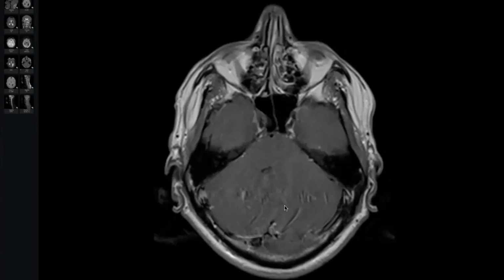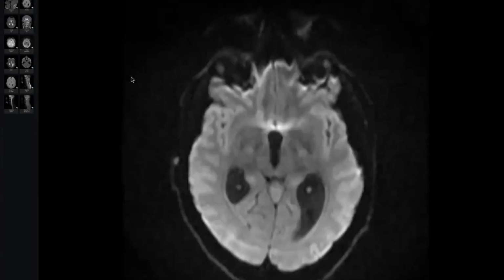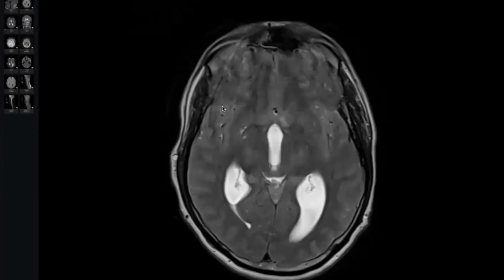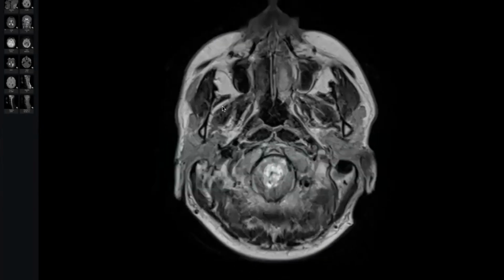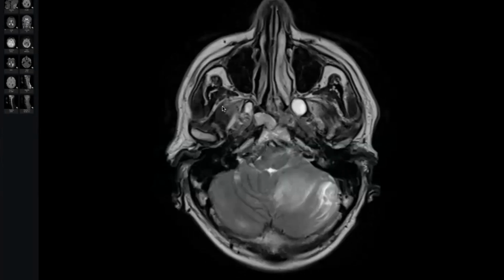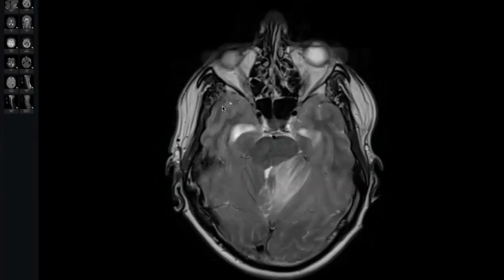First, we should talk about the brain because there is mass effect. See here, there is marked compression of the cerebellum. So we must talk about this at least. And then our routine usual pathway like abdominal ultrasound, rule out RCC, and the family screening like this.